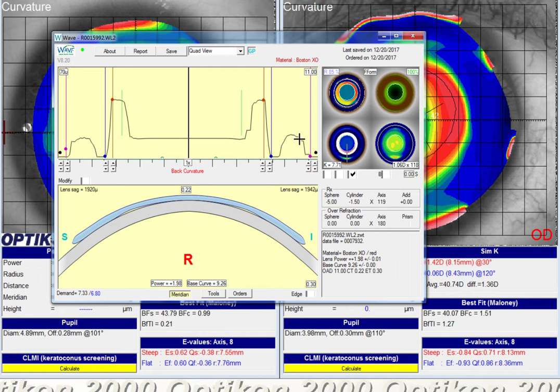And here we're at about 43, 44. So we've got a 17 diopter difference between the alignment curve here. And this is just artifact.